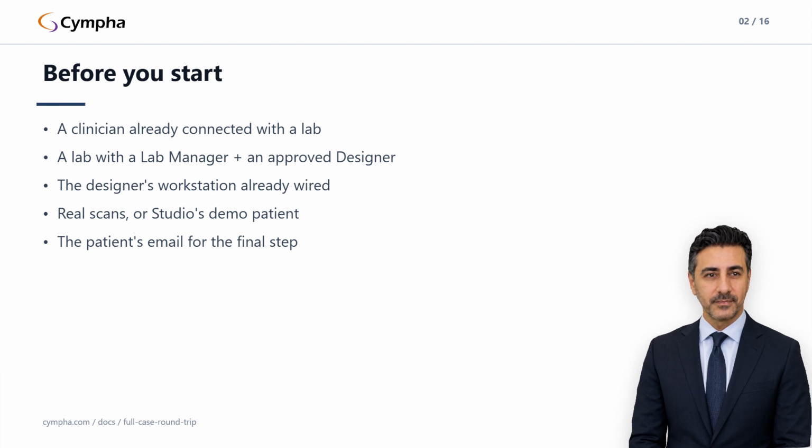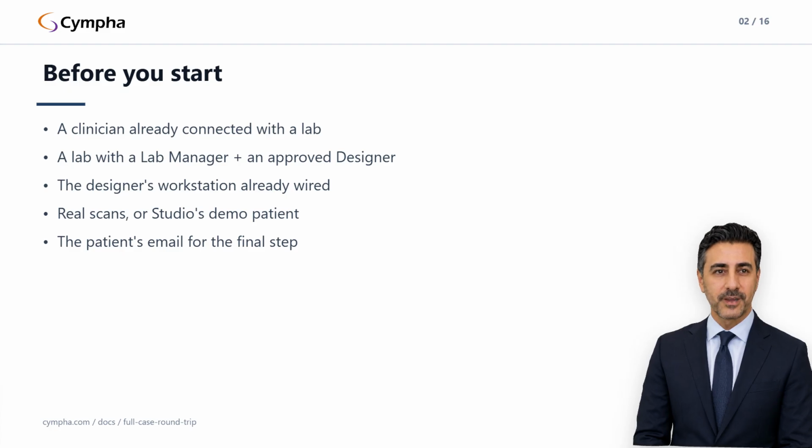Third, a scan set. And here's a nice touch: Cympha Studio ships a demo patient, and the workflow is identical whether you use real intraoral scans or that demo. So you can rehearse this entire round trip end-to-end without a real patient. I genuinely recommend it. Fourth and last, have the patient's email address ready, because you'll need it in step 8. And if this is your first Cympha case ever, the What You Need guide covers the prerequisite checklist from scratch.